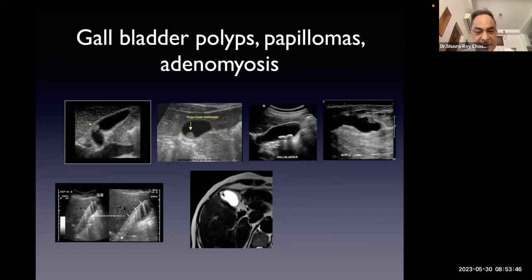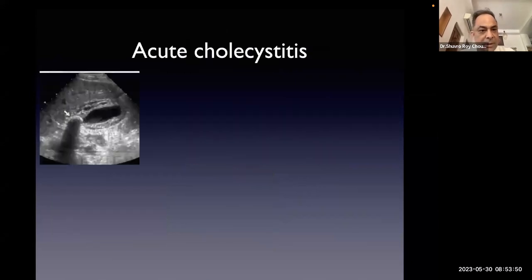This is something like adenomyosis, like we talked about. So this is a classic acute cholecystitis. I think you were asking me, Makonda.